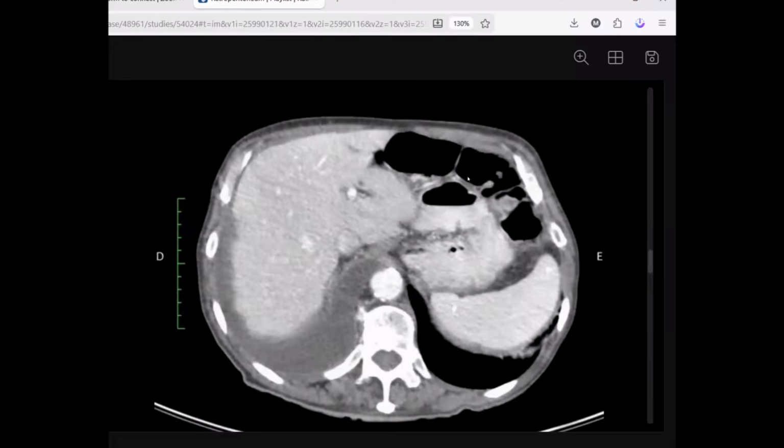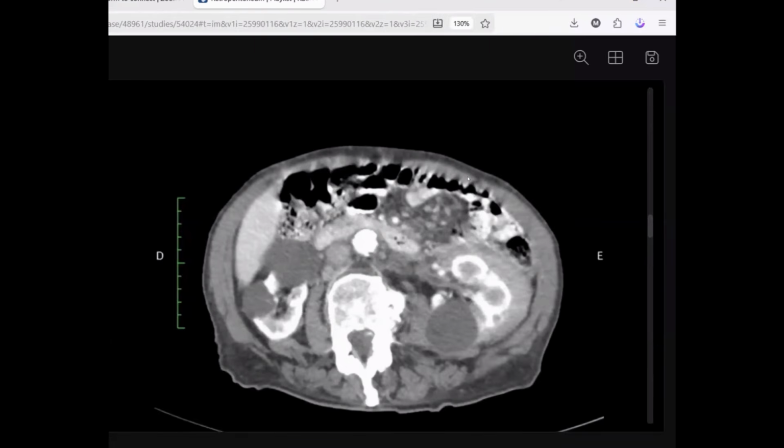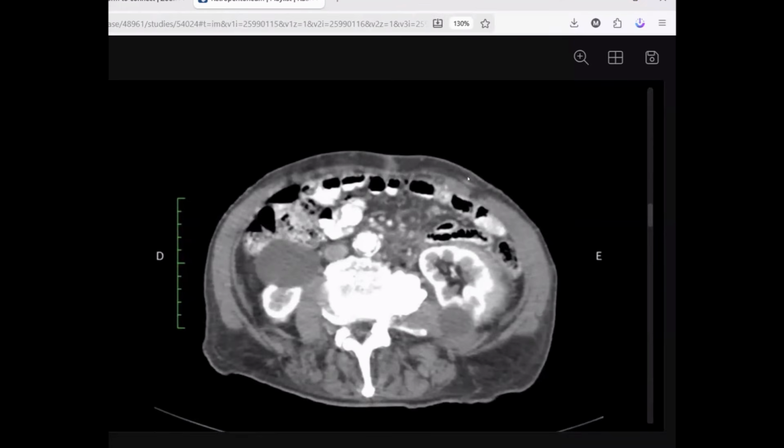So your differential diagnosis may be perinephric hematoma or perinephric collections, but it's not matching with perinephric collections or abscess. But the perinephric enhancing soft tissue sheets may be perinephric lymphoma, and we also have retroperitoneal discrete enlarged lymph nodes, as we saw together. So renal lymphoma should be considered, and it was proved to be renal lymphoma.